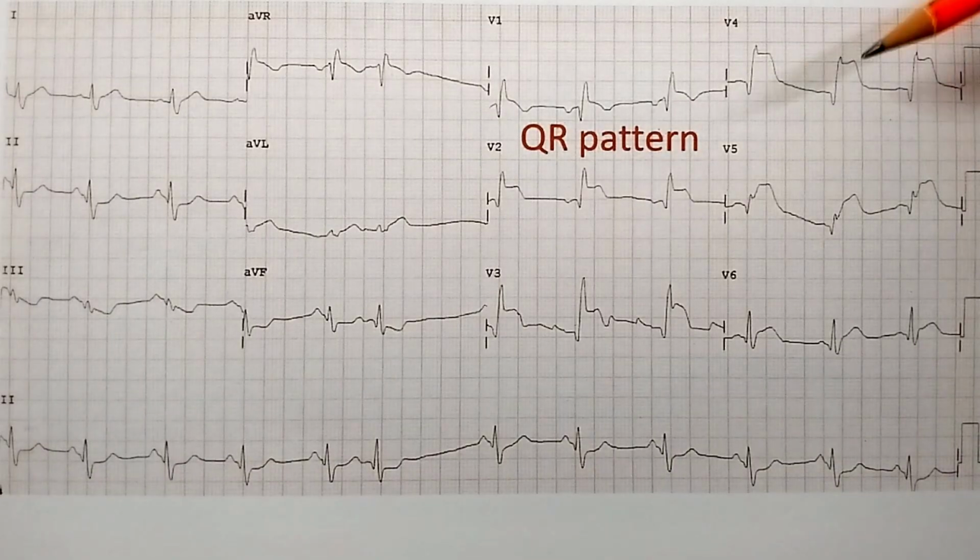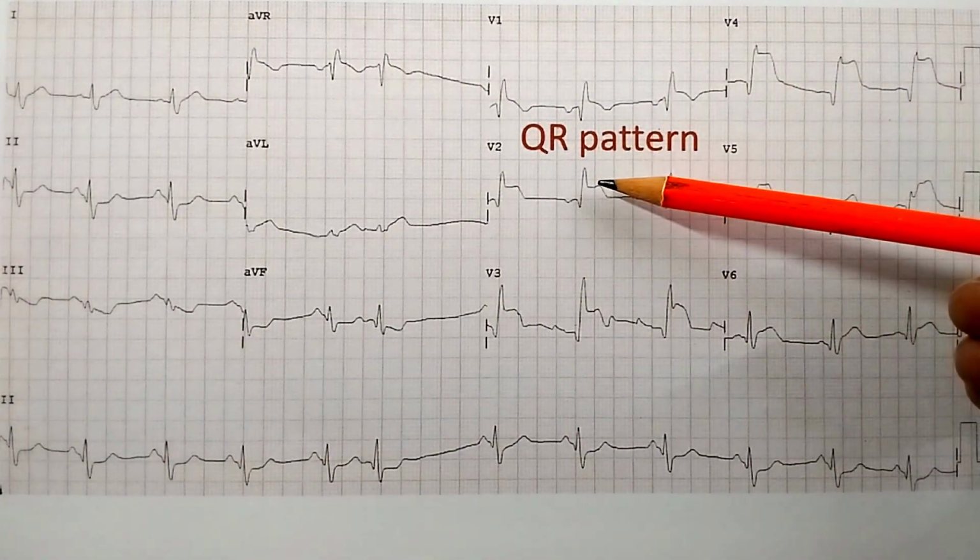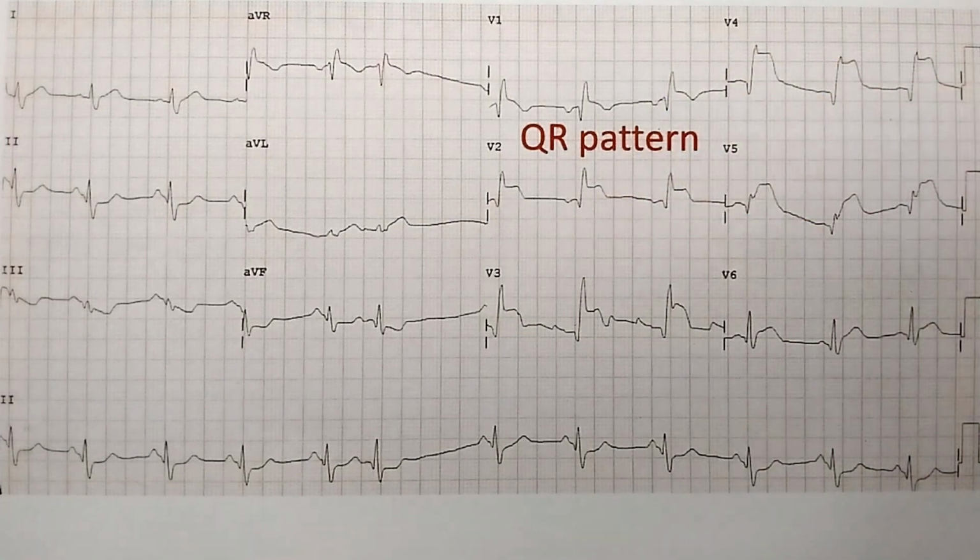Fairly early, high ST elevation is seen. T is not fully inverted. Probably this is more of a hyperacute phase. Here it is almost horizontal. I would have expected upwards. If it is truly hyperacute, slightly beyond, something between the evolved and hyperacute, I would say.